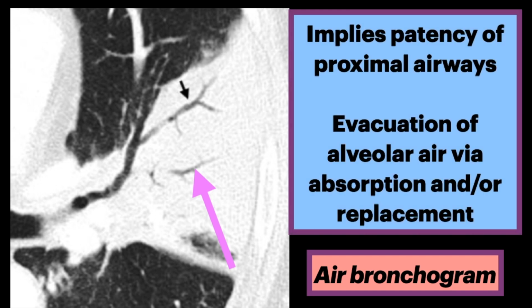This sign implies patency of proximal airways and evacuation of alveolar air by means of absorption, atelectasis, or replacement, i.e. pneumonia, or a combination of these processes.